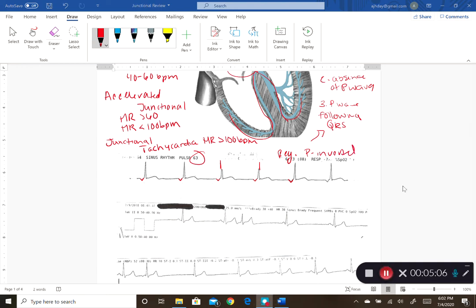The next part we'll look at is our ST segment. So here's my ST segment, my J point, where my QRS ends, going up into my T wave, and it seems to be right on that isoelectric line. So I don't have any ST segment deviation, so I don't need to add any ectopy. So let's go ahead and name this rhythm.